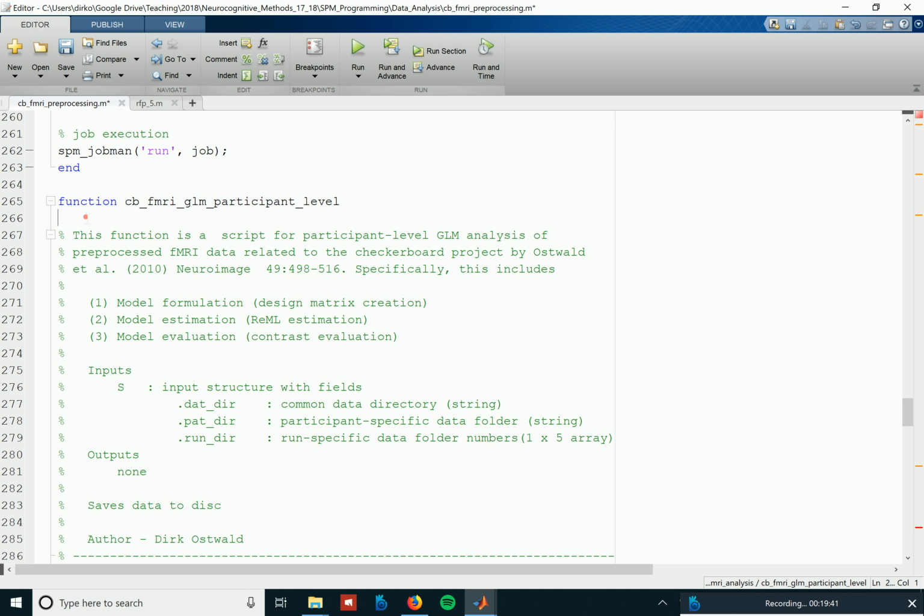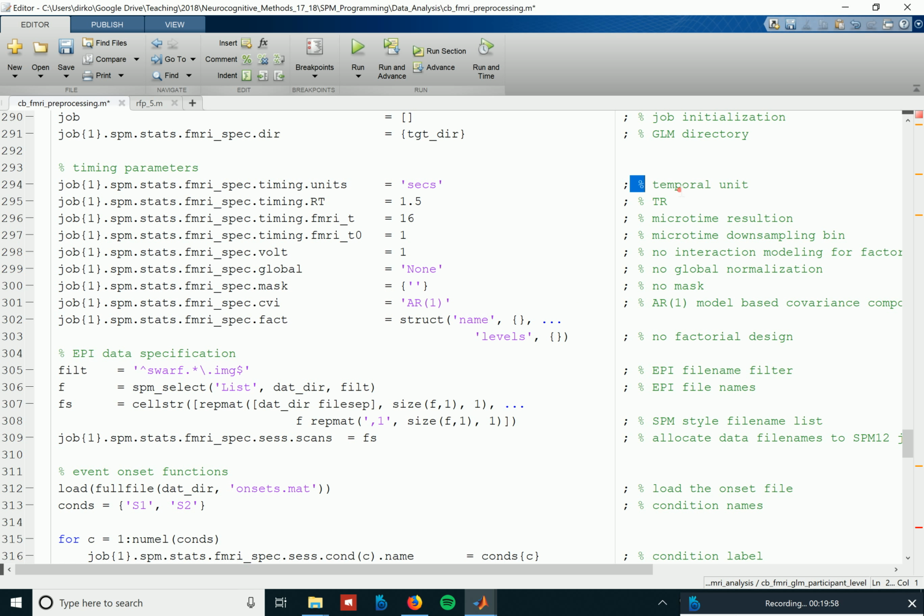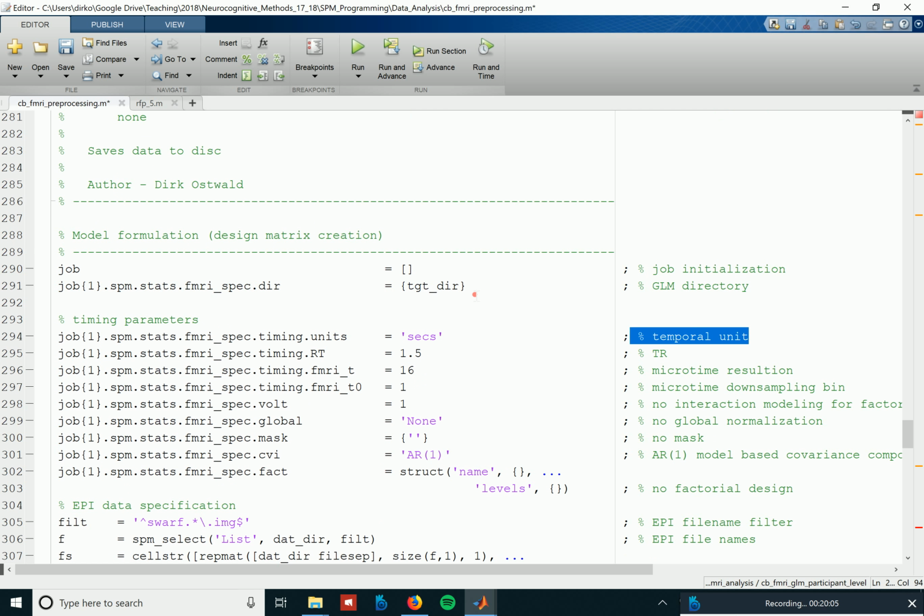This one I now adapt from myself, so I don't care. And these kinds of scripts are not really that demanding cognitive creations, because you get them essentially out of SPM directly. The only things that are cognitively demanding are the comments, because at least there was some effort to understand what's going on.